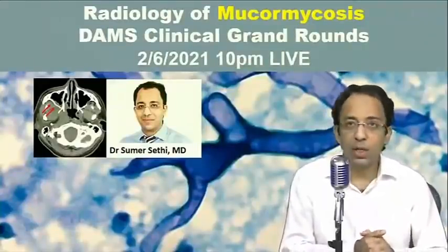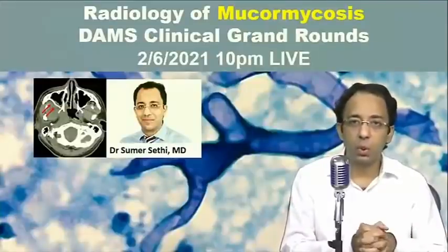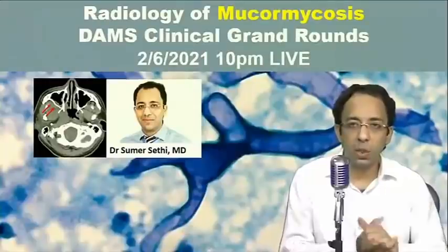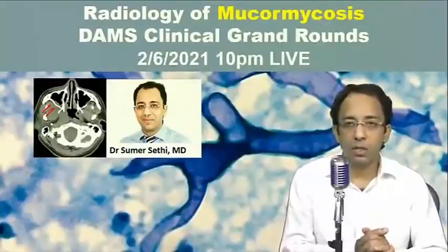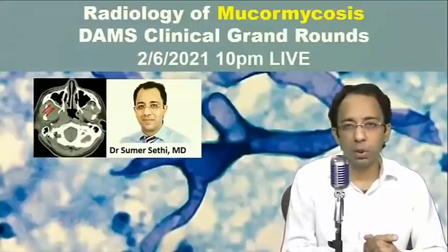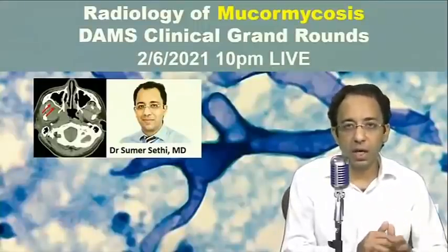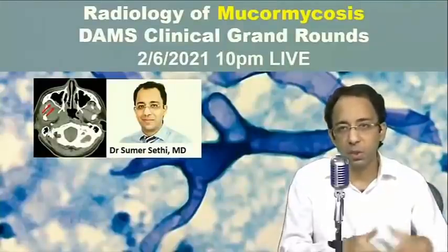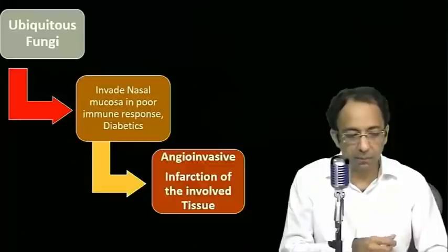So how would you identify this on radiology is going to be my topic for today. I will talk about both sinonasal mucormycosis and pulmonary mucormycosis, the radiological findings, and I feel there might be a question about this in your upcoming exams as well. So let's understand it further.